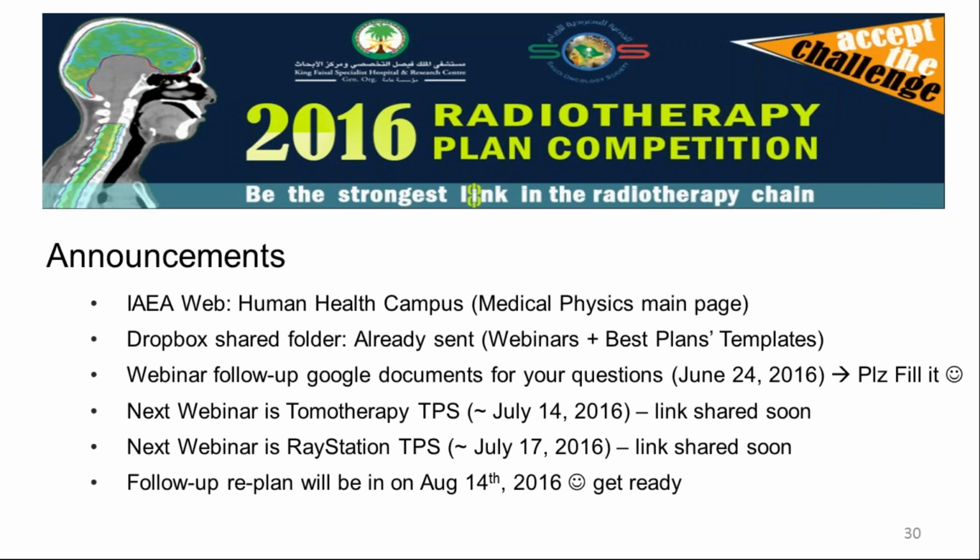So if you have used Monaco, you will find one or two plans as a best plan in Monaco. You can simply import it and see how the planner made it. And the same thing applies for Eclipse, for IMRT as well as VMAT.